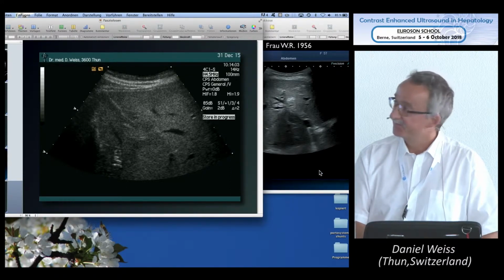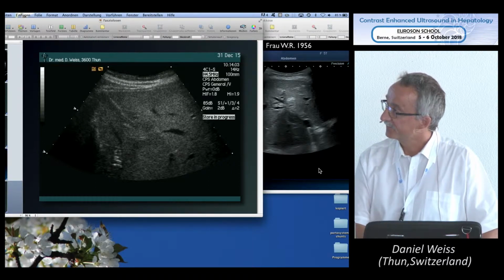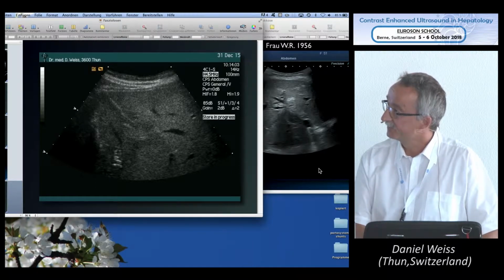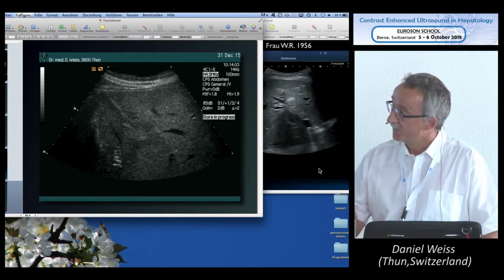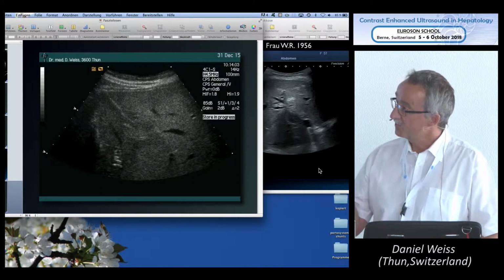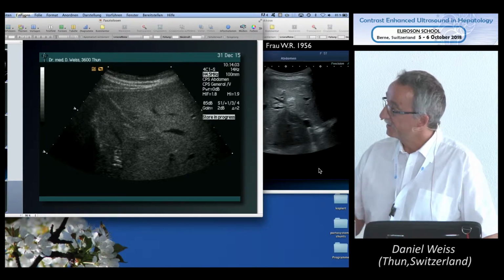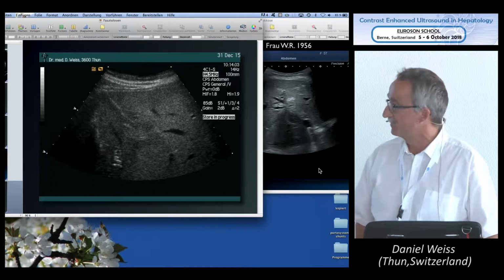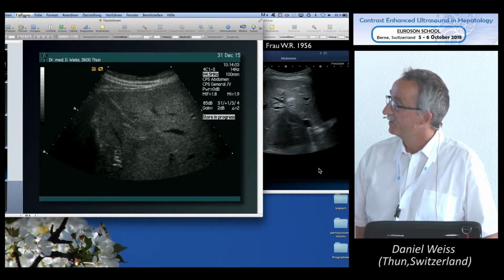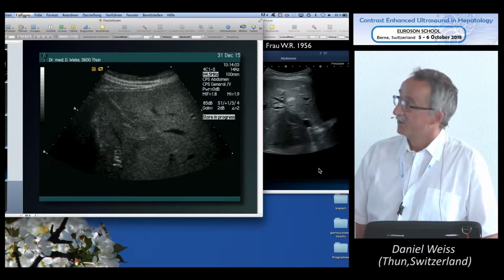So when you see a patient like the first one, at the first presentation, you thought that it could be an alveolar echinococcosis, right? No. Also on the first one. The first one, this was the owner of a drugstore. This one, you already thought on the first image that it was not an alveolar echinococcosis. It was an absolutely classical picture of a liver fluke disease. So you already thought it on the very first examination. Yeah, very good.